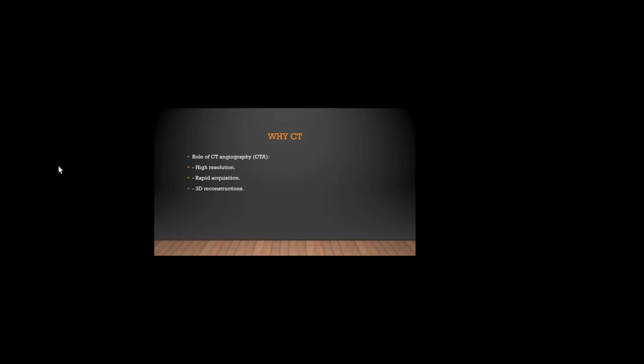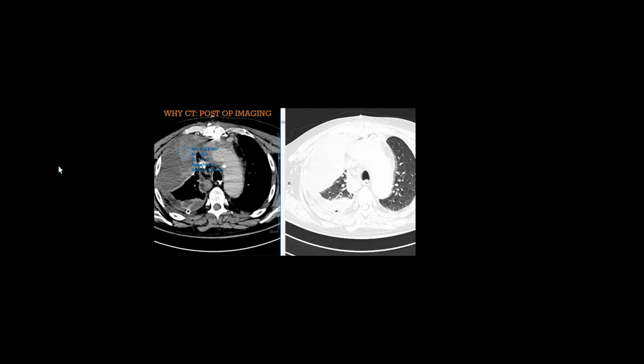They are in space, so we could show the anatomical relationships to the sternum, and also we could see the complications. We could measure whether there is a hemothorax, or there is a sign of hemopericardium, or tamponade associated with those cases. Also, CT can provide insights.